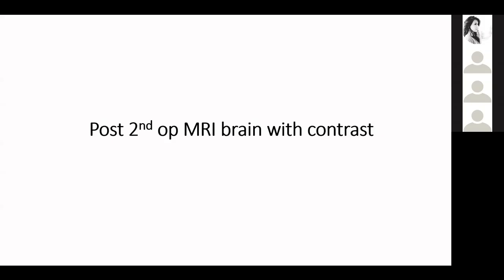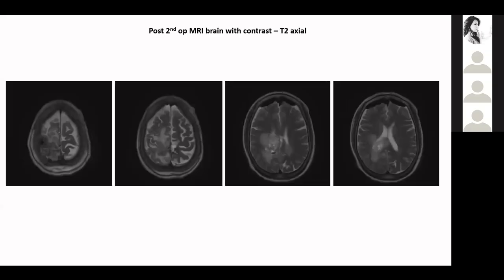So thank you. She again underwent surgery, and this was the post-second op MRI brain with contrast. So this was after the second surgery. Can the radiologist please comment on this scan?